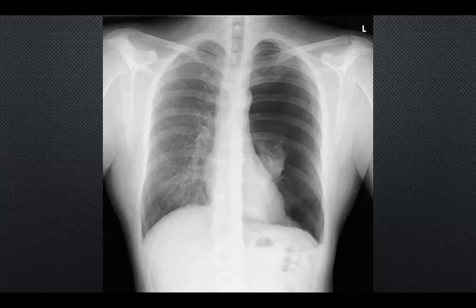Is it, teacher, a pneumothorax? Yeah, that's great. So obviously this one is blindingly obvious. I jumped again to the diagnosis. I think that the left side is more blackened than the right side. We can see it's more black, that's why I can see it's a pneumothorax.